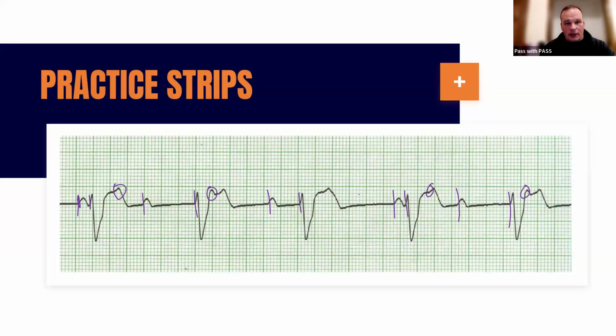So that is a third-degree complete heart block, a high-degree heart block that we probably need to go straight to transcutaneous pacing for, depending on how the patient's doing. Okay.